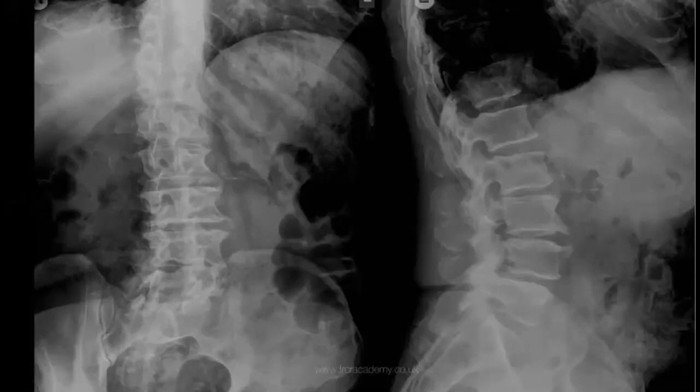You check for 4 checklists: gases, bones, soft tissues, calcifications. Is it difficult? I will show the answer.